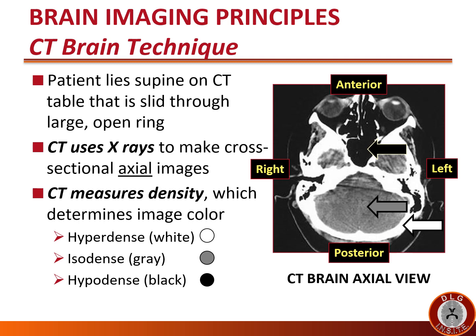Note that the top of the scan is anterior for the patient. The bottom of the scan is the posterior aspect of the patient's head. And as we talked about before, the right side of the head is actually on the left side of the image, and the left side of the head is on the right side of the image.